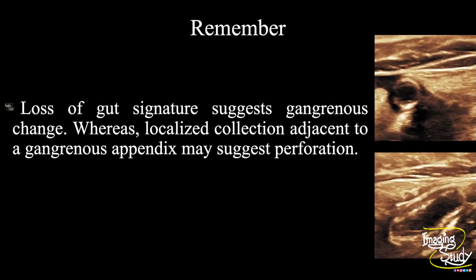Now the take-home message. The loss of gut signature suggests gangrenous change, whereas localized collection adjacent to a gangrenous appendix may suggest perforation.